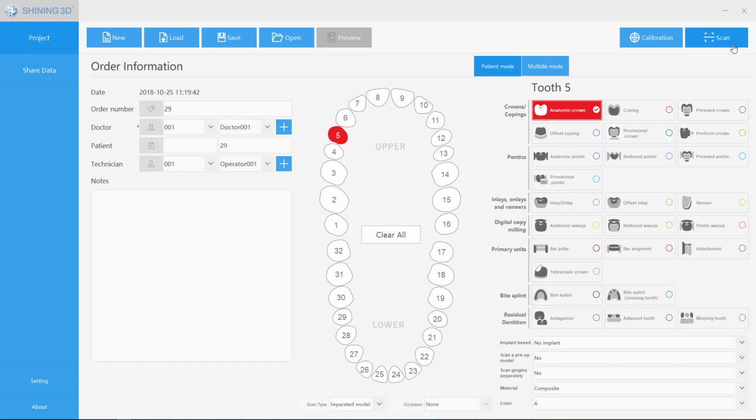It will be the scanner. It will be very simple. It'll just ask you to put the model up there and you can scan away. Now let's talk about a little bit more advanced. What if you wanted to do two models that are in occlusion?